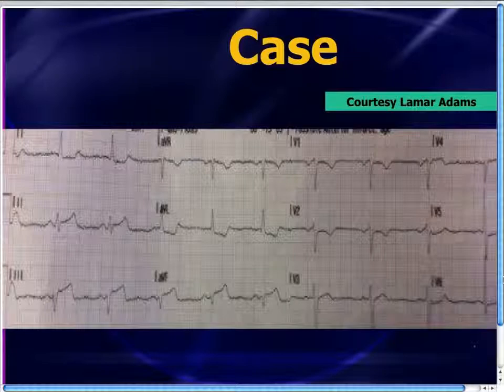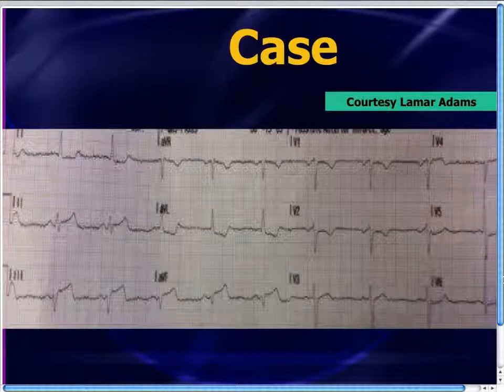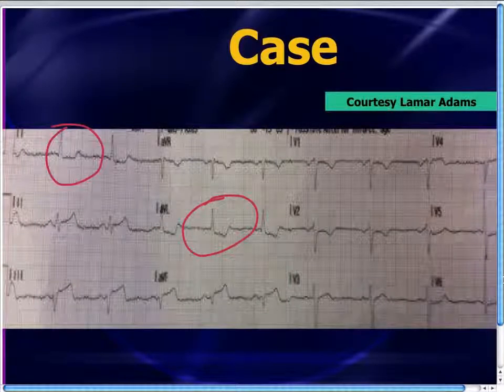And just quickly looking at the 12-lead EKG, doesn't look all that bad, right? Looks pretty normal, except for that STEMI. So there's clearly evidence of an inferior wall STEMI. There's very nice ST elevations, as ST elevations go. There's also some reciprocal changes in the lateral leads 1 and AVL, and that's very typical for inferior STEMIs to produce reciprocal changes in leads 1 and AVL, especially AVL. I think we've talked about that before.